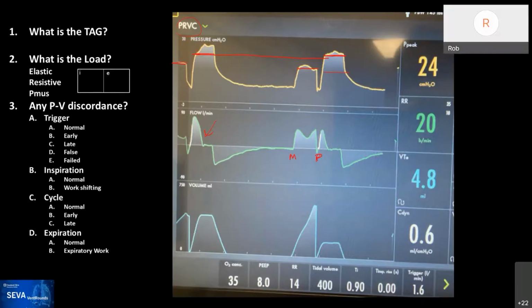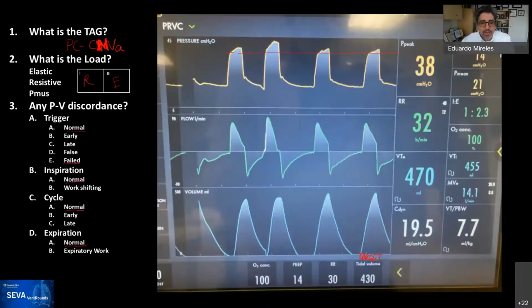All righty. Ryan is asking us, do we want to aim for a more squared pressure waveform? So your question is, should we use rapid rise time instead of a slower rise time? As you probably have heard us say, Ryan, we usually use the shortest rise time possible, to minimize any work of breathing. Because if there's a pressure spike over here at any time, it really doesn't bother us because it doesn't reach the alveoli.